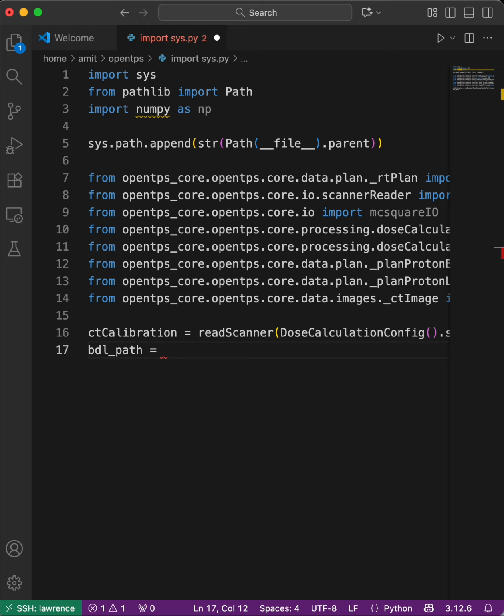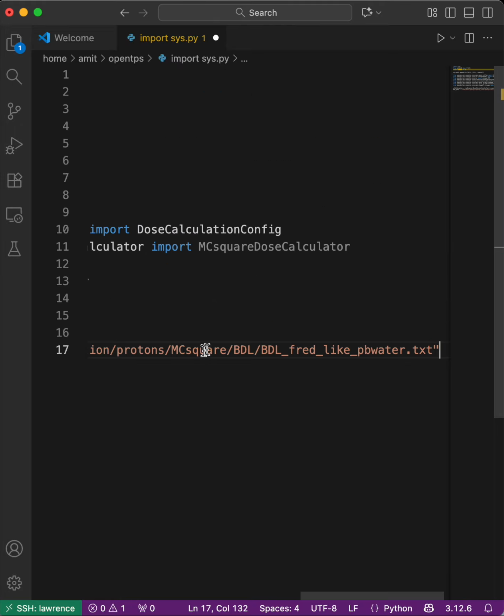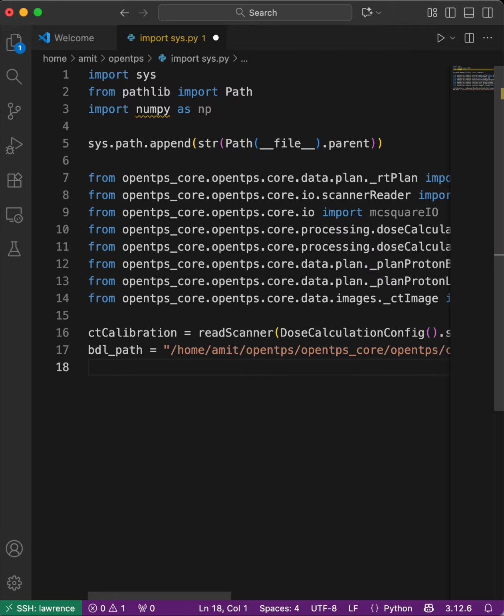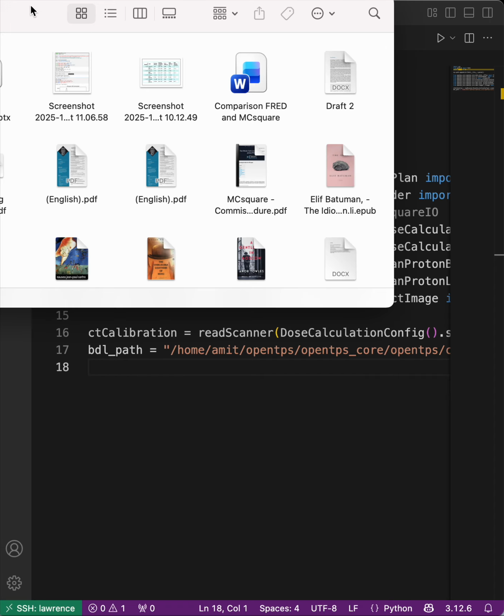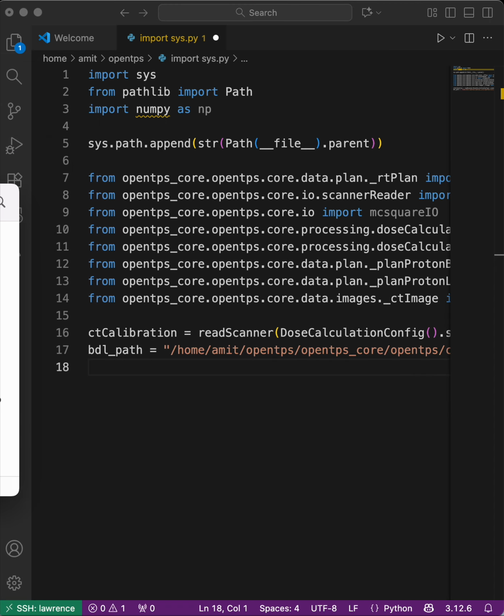and saved it as another copy. I don't want to make changes in the original one, so that it will not be ruined, or maybe later on it will be difficult to find, or just to make things smooth. So that's the file I changed. I will show you actually what I changed. Where is it? Let me find it for a while.